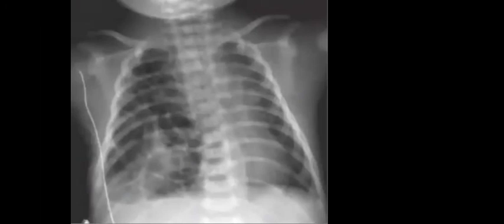Spot diagnosis. The first thing that you should comment on, if you see it, is the endotracheal tube, in satisfactory position. There is in the right hemithorax a lucent lesion, and the most important thing to mention is that there is mediastinal shift to the contralateral side. You will check whether the hemidiaphragm could be visualized or not. So in case that you didn't see it, you are going to mention that it could be congenital diaphragmatic hernia.